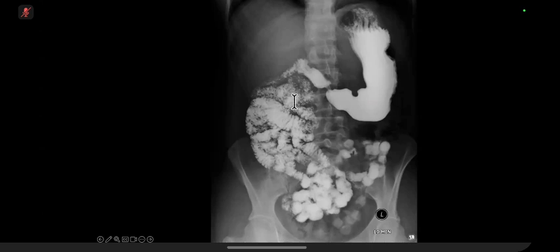But all you really need for malrotation is there's the pylorus just here, and the DJ flexure should be up here. Should be on the same level, okay? And anything that doesn't conform to this is a form of malrotation, okay? But this is really quite marked malrotation.